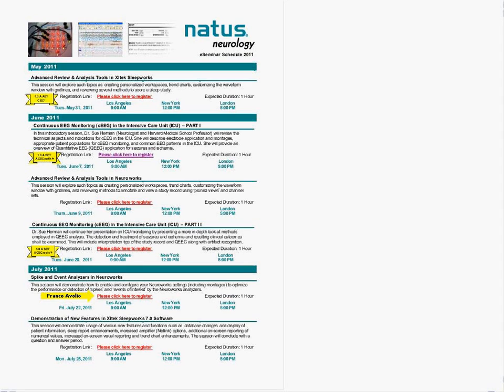And so now I will begin, and I'm going to share my desktop as I will be demonstrating most of the features today using my laptop.